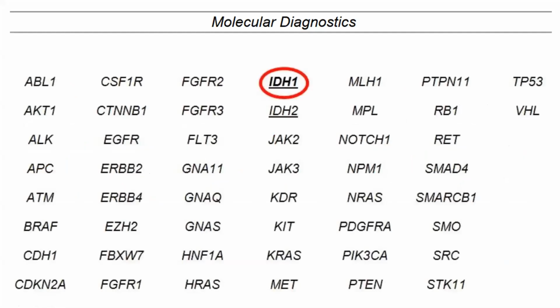And here it is. This is the Oncomine, also known as the solid tumor genomic assay, that we use here at MD Anderson Cancer Center. It's a visual display, so we can see patterns that way. Underlined genes are genes that the neuro-oncologist has requested. Circled genes are those that have an alteration, and we'll see what the specific alteration is in just a second. But the visual display is highly effective in telling you instantly that there's an alteration.